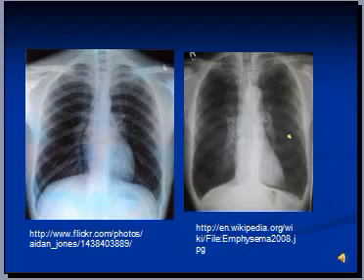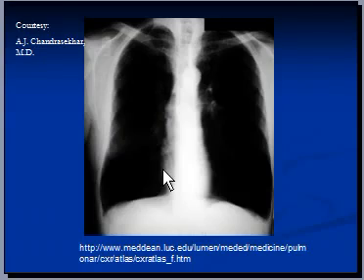Another feature is the narrowing of transverse diameter of heart. This is the transverse diameter of heart, and I'll show you a good X-ray. So narrowing of transverse diameter of heart is very clearly visible in this X-ray. The lungs are hyperinflated, they look darker than normal, the diaphragms are flat, a very classic picture of emphysema. Somebody may argue that this hyperlucency may be a result of overexposure. Well, this film is not overexposed, because if it was overexposed you would see the thoracic spine.